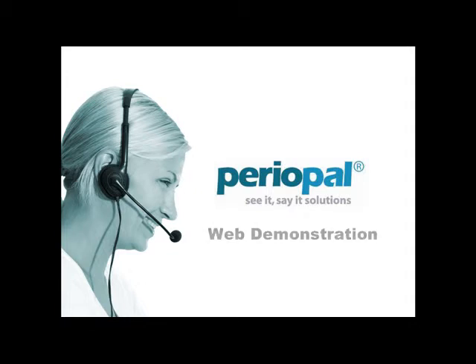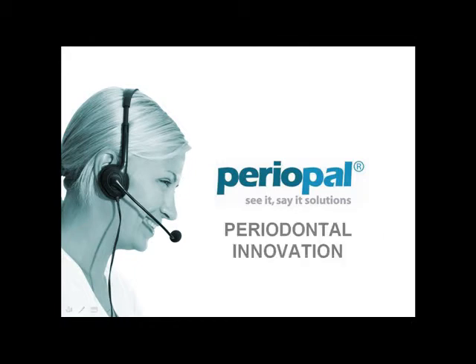Thank you for your interest in PerioPal software. This demonstration will provide you with an overview of PerioPal's features and functionality.